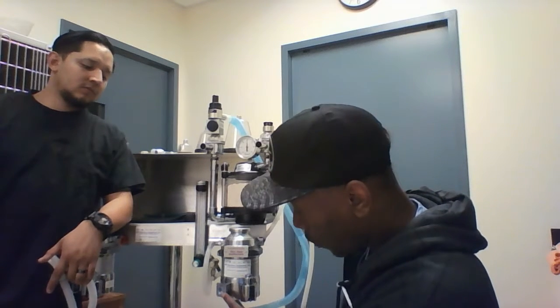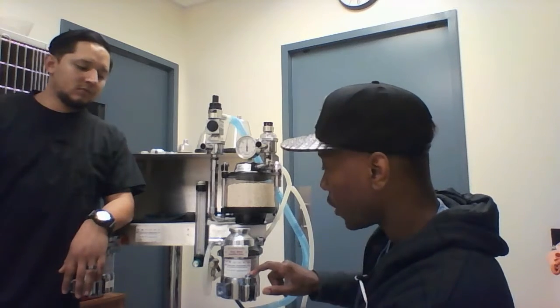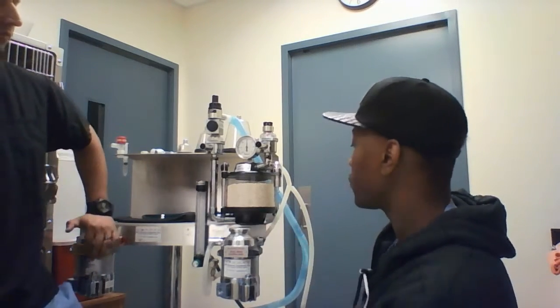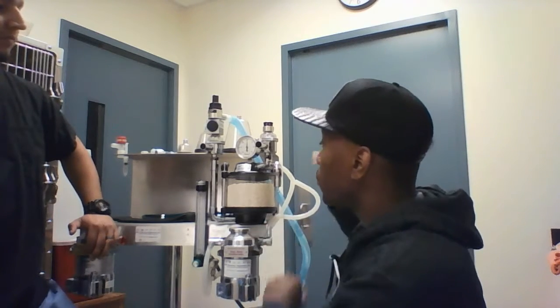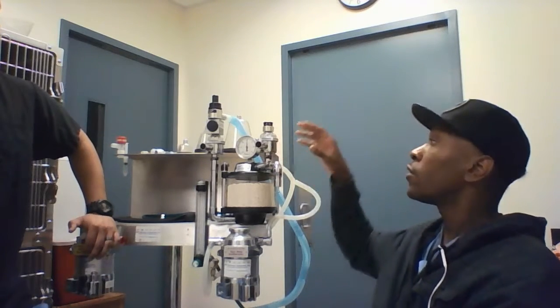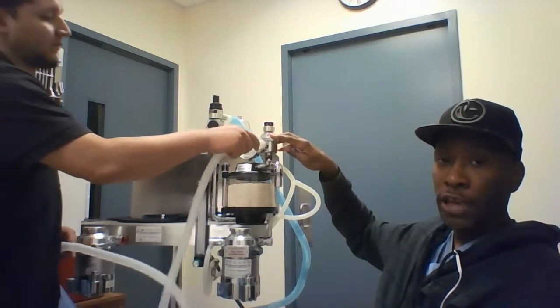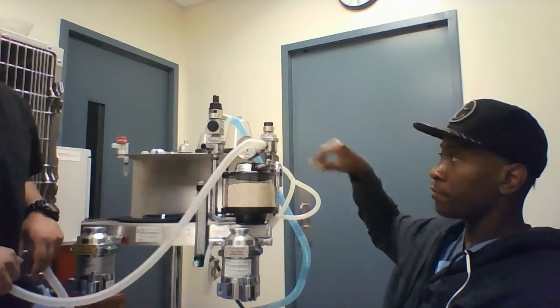You have an indicator window here that shows you how much isoflurane is left in the vaporizer, along with the fill port here. Once your anesthetic gas and oxygen have been mixed together in the vaporizer, they will travel through the machine, through the vaporizer outlet port, to the inhalation valve, through the negative pressure relief valve. You have a flutter valve here, which will show you when your patient is actually taking breaths, because the flutter will actually flutter right here.